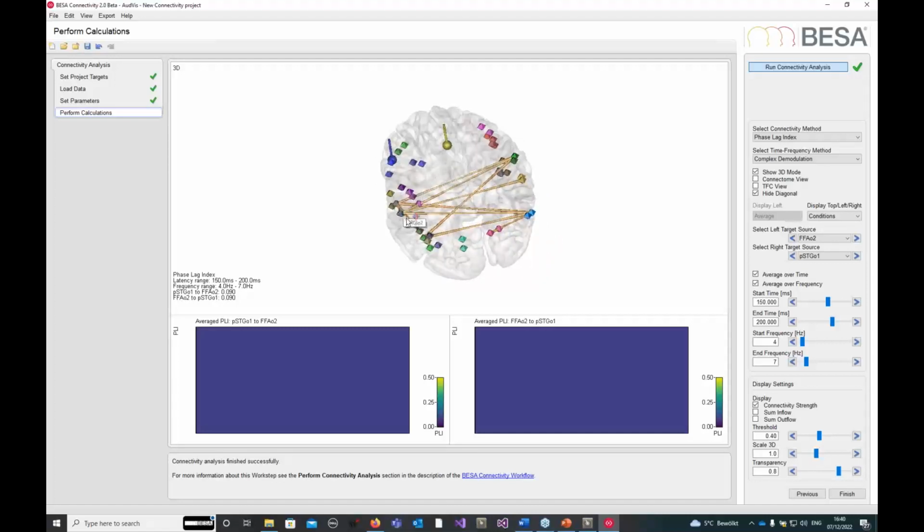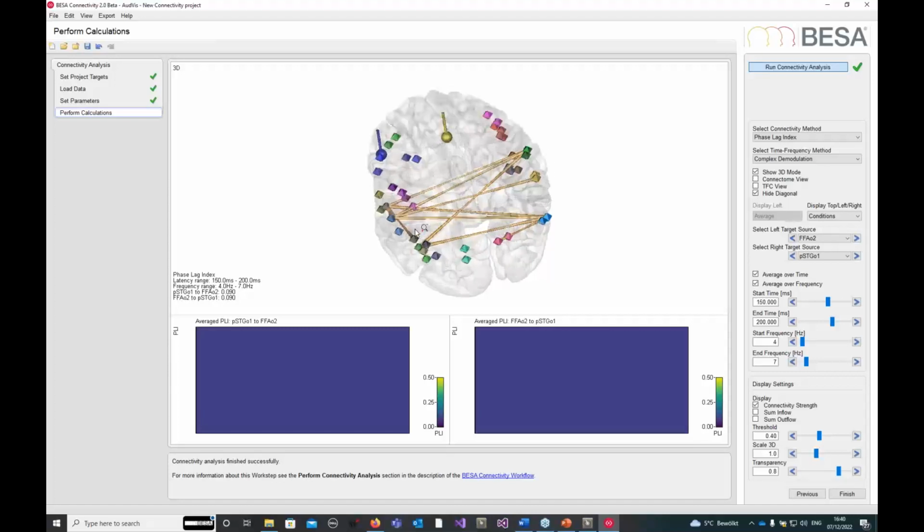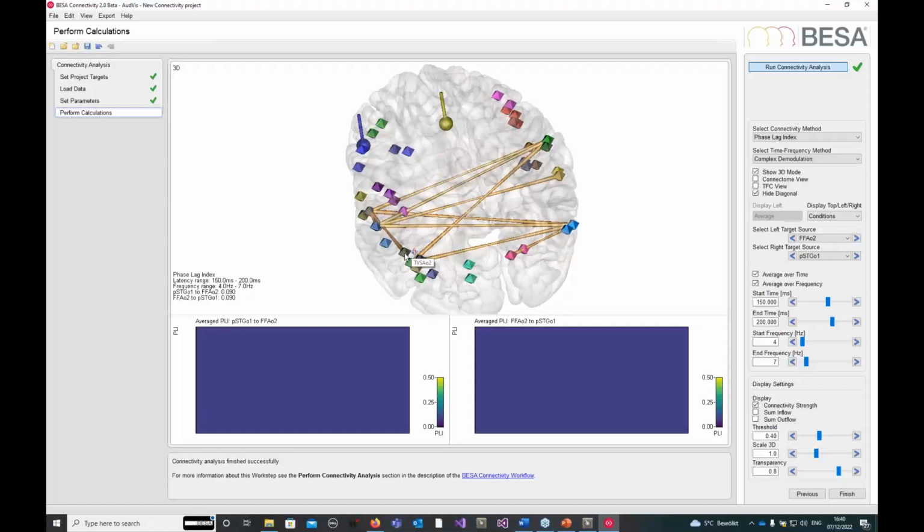So obviously I can already conclude that there's something more going on in the audiovisual integration on the left side compared to the right brain hemisphere, which is also pretty much in line with what we would expect, because some of these particular specialized brain areas are on the left. So let's have a look at the channels that are involved here. There's a TVSA02. And if I'm interested in a channel like that, then I can also simply select this from the display here, and it's connected to the supratemporal gyrus, orientation 2.